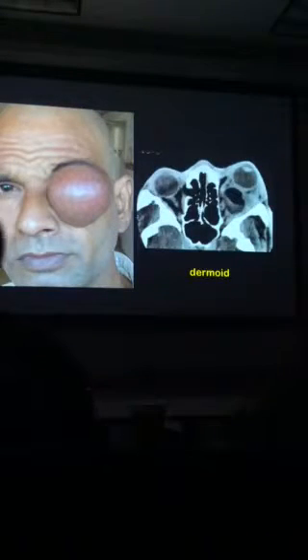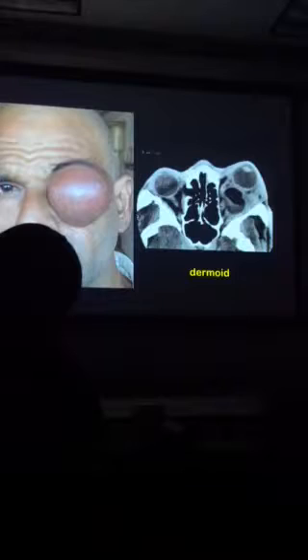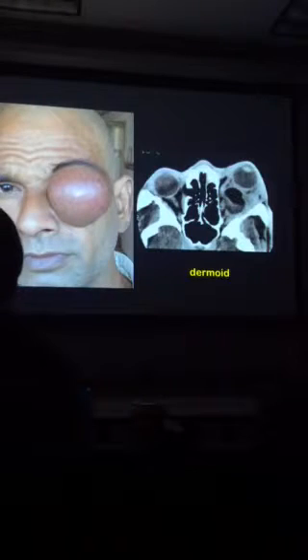So those are benign. This guy has a dermoid under his eyelid. That's his eyelid. Again, how did he wait so long? Do something about that. How could you go all that? I mean, years, right? That had to be years, yeah.